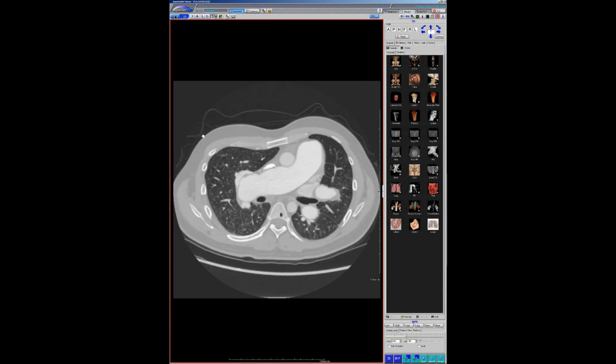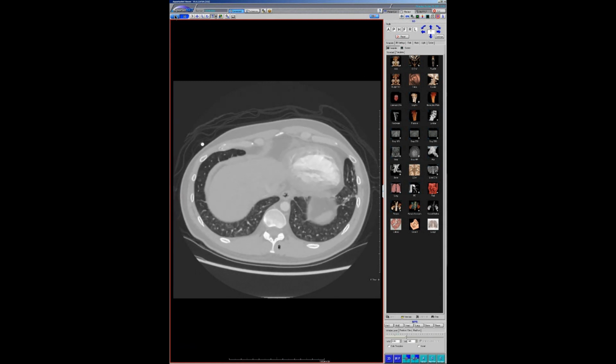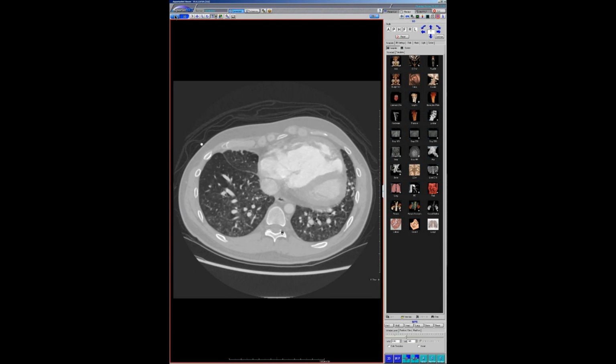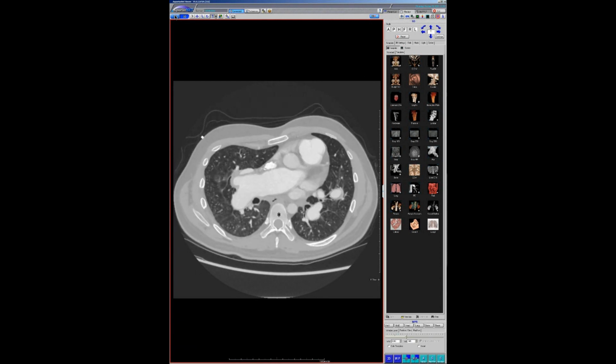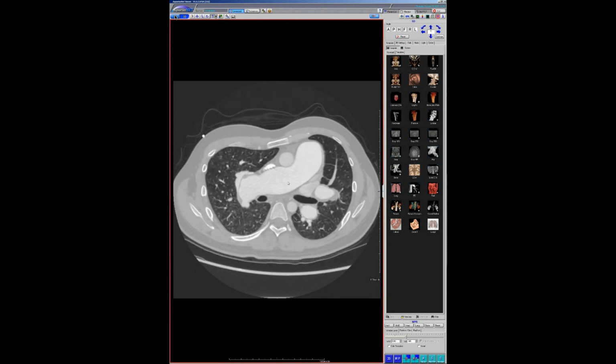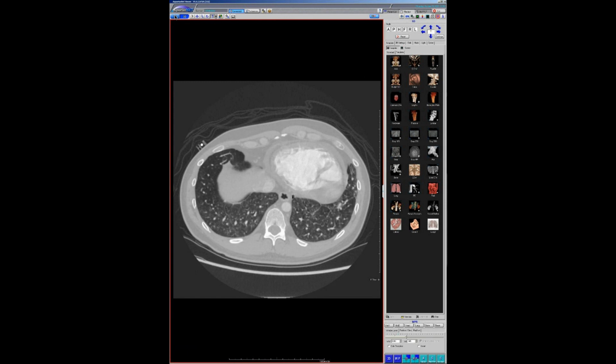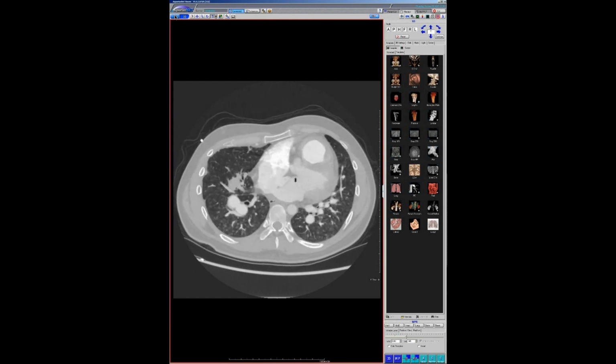And the nice thing, or kind of nice thing, is that, let me pull this to the side. So I looked at his cath report, and I was a little bit disappointed because I saw his cath report. So here's just a picture of his 2 LAD lesions.